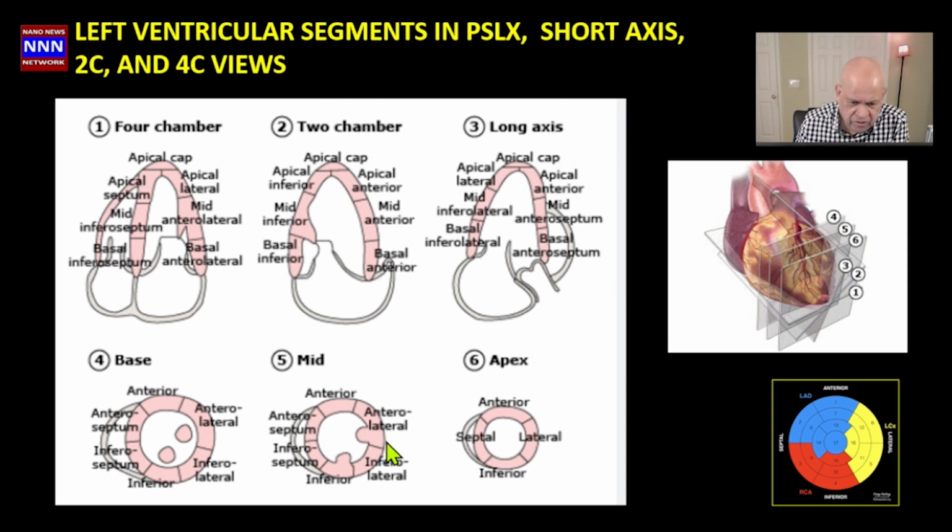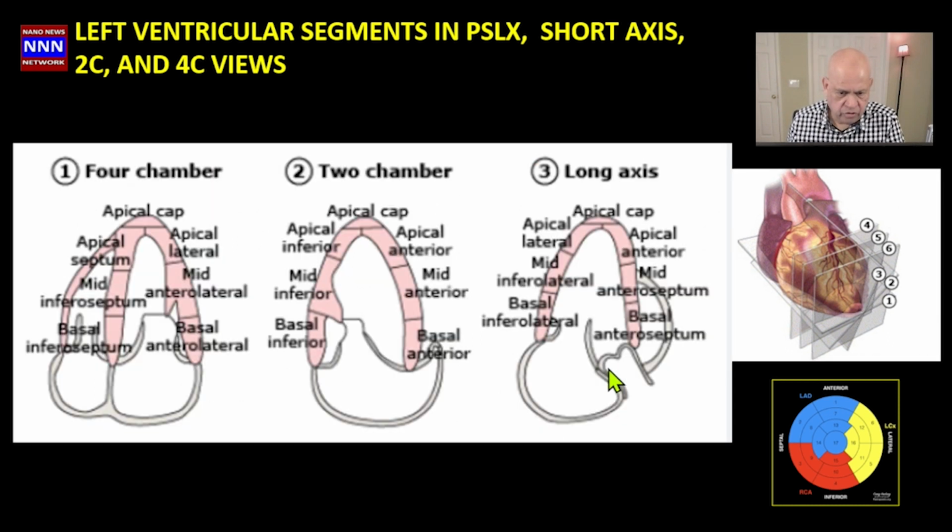But the terminology is a little confusing, though not misleading. But if you are doing echocardiography, you need to stick to the echocardiography definition. So by echocardiography, this four-chamber view is showing anterolateral and inferoseptal. So remember this diagram, just imprint it in your mind. That should answer most of your questions.